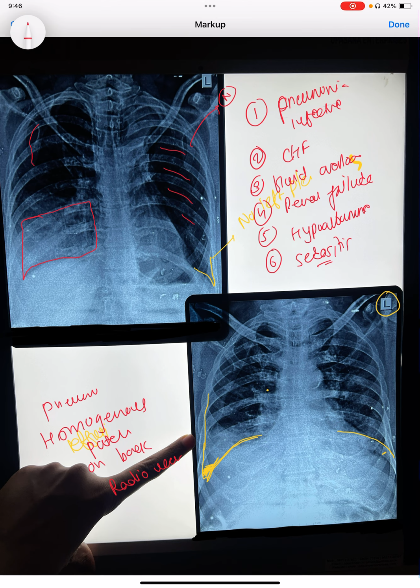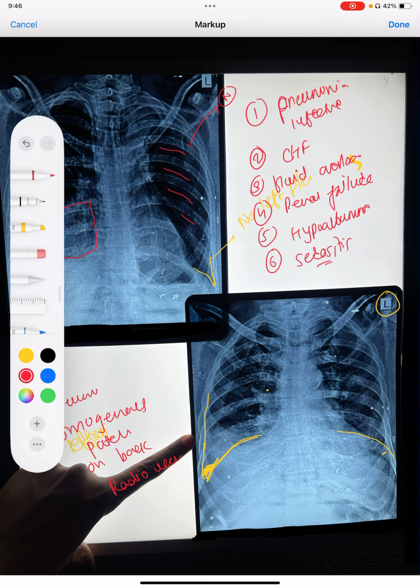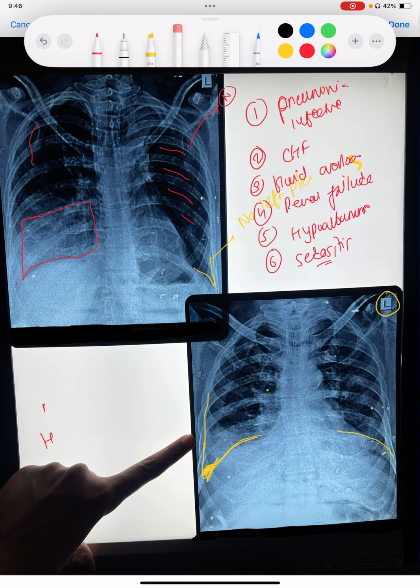So this is pneumonia. So there must be a pneumonia with an effusion because this angle is blocked. If the prominent effusion is there, usually we get a meniscus sign. What is meniscus sign? Meniscus sign is basically whenever there is prominent effusion and not consolidation.